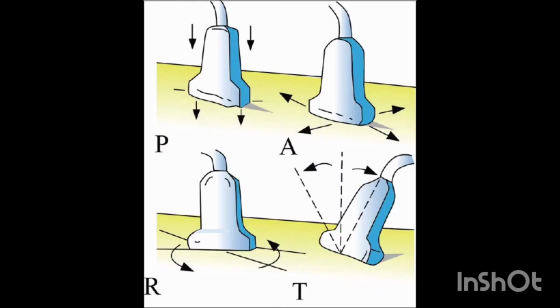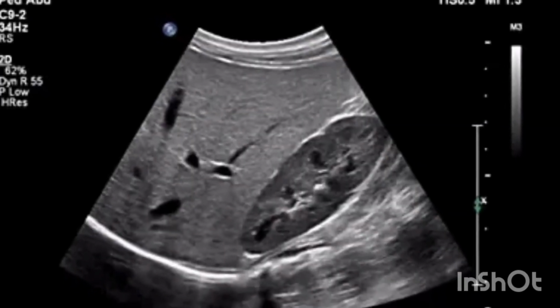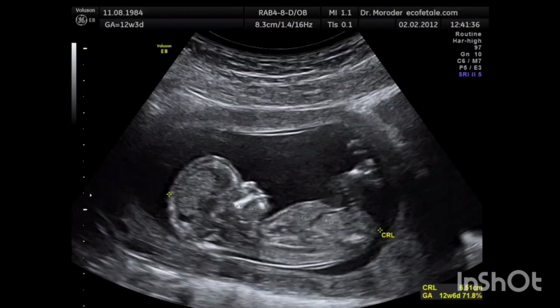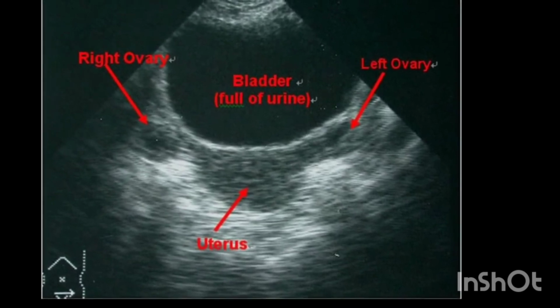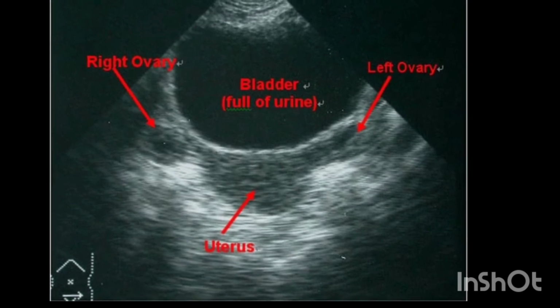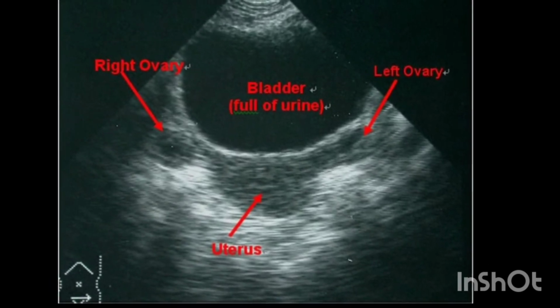Now, we have learned about the handling and inclination techniques of a transducer. Have you ever looked at an ultrasound image and wondered what you are looking at? Ever wonder which end is up? When others are discussing bull-heifer, ovarian diagnosis, or metritis treatment, are you still trying to decide what it is? Well, if you feel left in the dark when it comes to ultrasound images, let's start back at the basics.